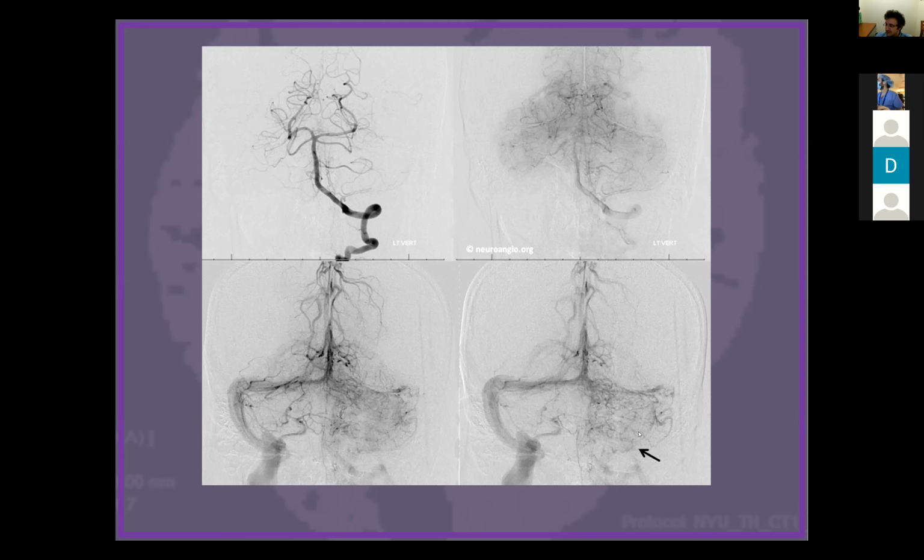Obviously, part of understanding is you start to appreciate that there's a lot of venous congestion over here. You want to put this together: you don't have a transverse sinus, or maybe a little bit. You don't have a sigmoid sinus here that you can see. There's a lot of congestion. The congestion is resulting in, you see how well you see the anterior pontomesencephalic vein here. Now that might be just because of how that person is, but probably not. The reason it's probably more prominent is because stuff is trying to decompress from here, trying to find ways out.